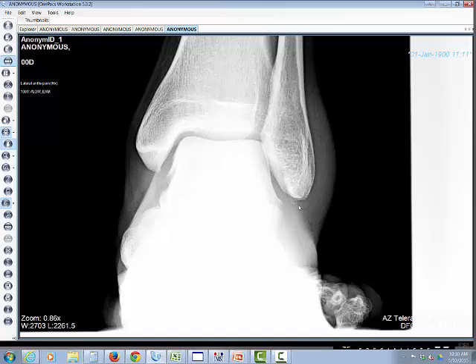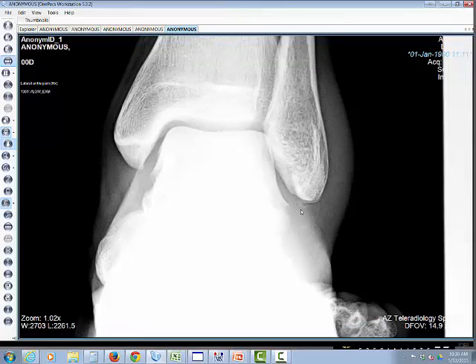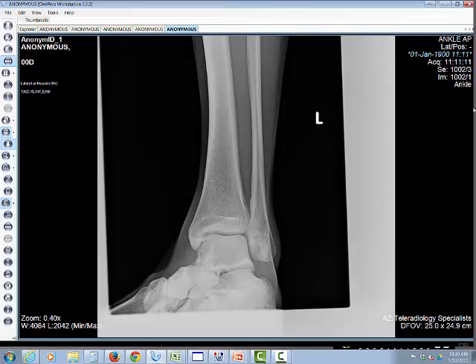I want to point out that the avulsion fracture has this typical curvilinear kind of jagged appearance, and that is typical for an avulsion fracture as opposed to accessory ossification, which are commonly seen here, and those are going to be round and very well defined. Of course, we can't tell exactly the age of this based on its radiographic appearance, but the soft tissue swelling certainly would suggest that it is acute.